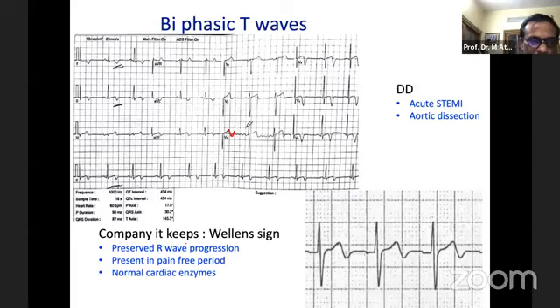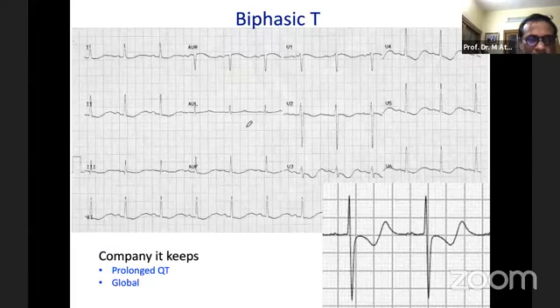That is positive followed by the negative. This is another example of T wave changes. Here the T wave is flat, there is some deformity of the T wave, like this. That is the long T wave. There is some spoon shape, going downward. So this is a special type of T wave. This is not like the normal T wave.